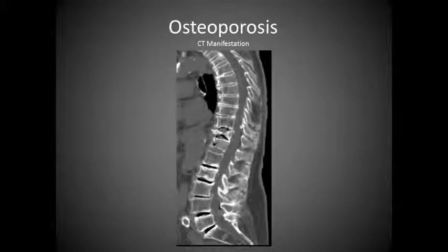Okay. Here you can see, once again, osteoporosis. We know that this patient probably has advanced age because we have calcifications in the aorta here and here. And we do have in one of the common iliac arteries tons of calcifications. Also, we do have loss of bone density in the vertebral bodies. I notice we don't even really see much of any density here.